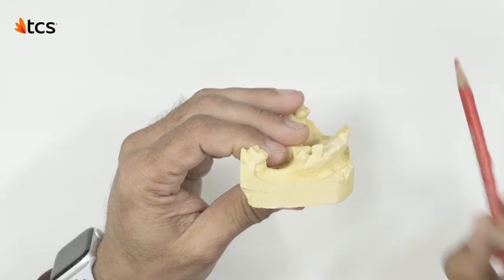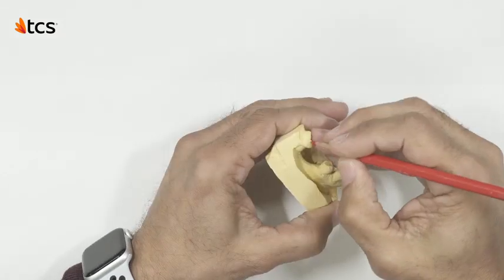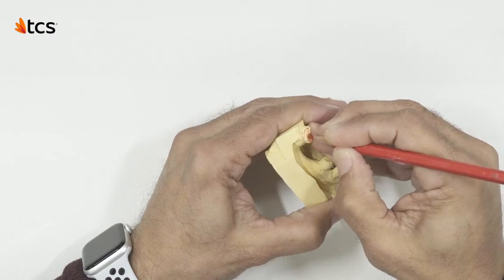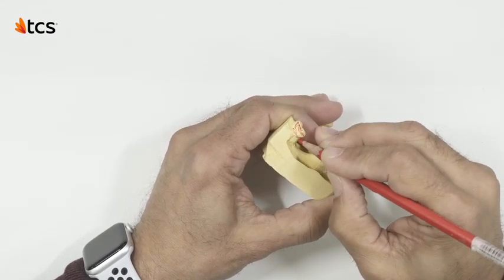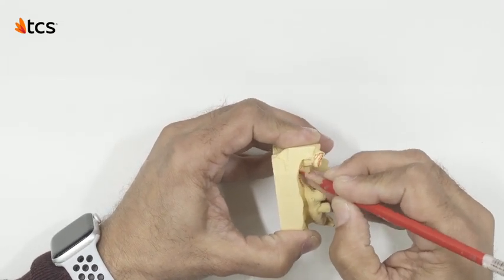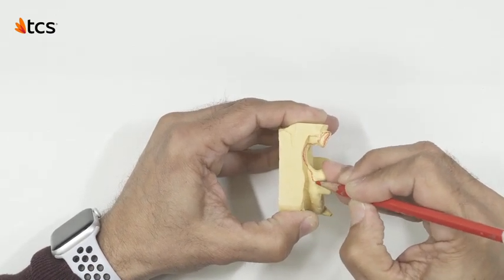In this section, right below the margin line of the molar, notice the lack of detail in the impression. Fortunately, our design for this molar is a high finger clasp and there is enough molar structure to achieve this. This serves as an example of how imprecise impressions can still work if they don't interfere with the design plan.